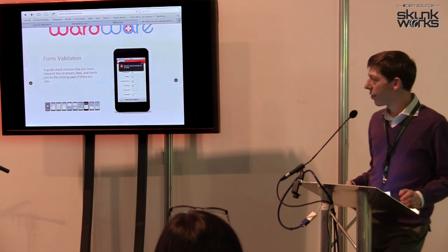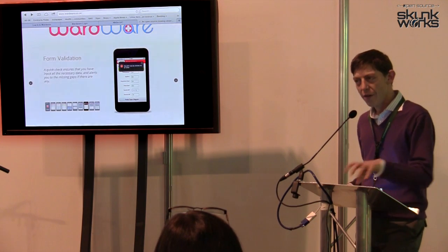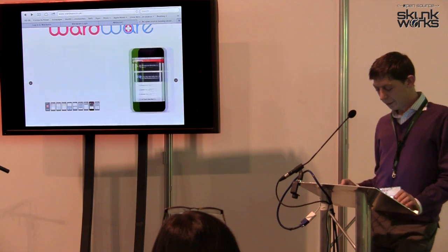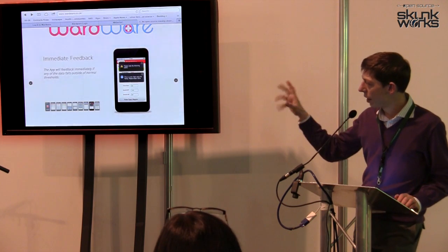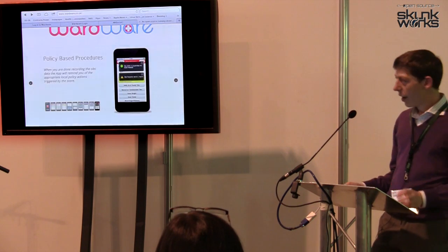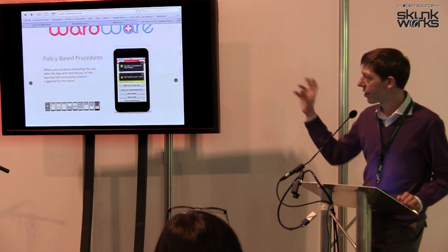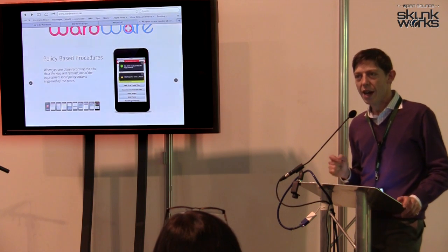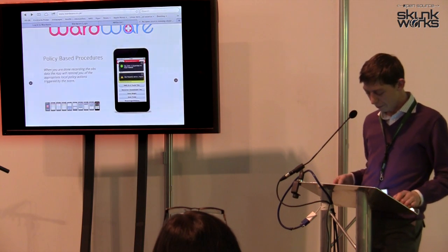And it validates all the data to make sure it's all within thresholds and values according to what your trust thinks are appropriate, fully configured, fully localized to each individual trust policy. And as I say, again, instant feedback there with quite clear pop-ups for the nursing staff. And the most important thing about capturing all these observations is actually then responding to them. So the last thing it does is, after you've done your observations, calculates the early warning score for you and then highlights the trust's policy for any given escalation that you're supposed to have based on the early warning score.